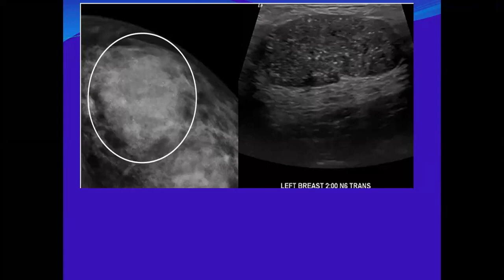Indistinct has a 44% positive predictive value, so it is still BIRADS 4B. If you add the microcalcifications, which are not pleomorphic but amorphous, it is BIRADS 4. I agree with you. If I upgrade it, it will be BIRADS 4C. To me, I am going to report it as BIRADS 4C.